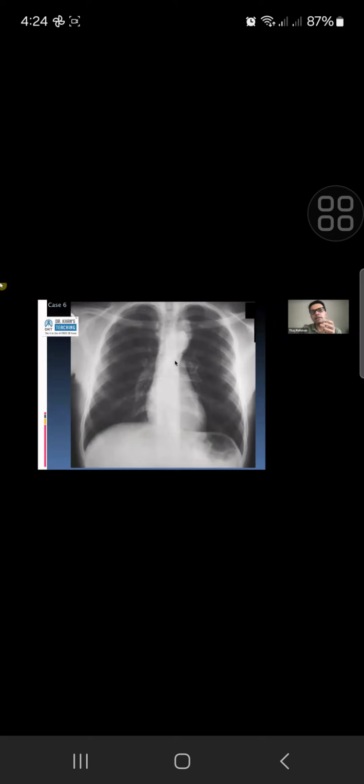So if you imagine the arch of aorta, which is what you're seeing projected on an X-ray, a mass still in the mediastinum, but not obscuring its margin, may not silhouette it. So that's not something that's useful. I wouldn't give a lot of importance to it. If it is obscured and it is quite clear to you and it is helpful, say it, but it may not be that helpful. And if it's not helpful, don't focus your mind too much on that.